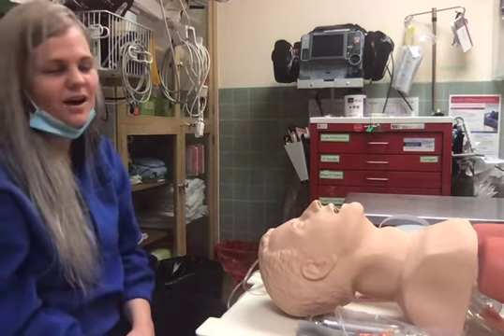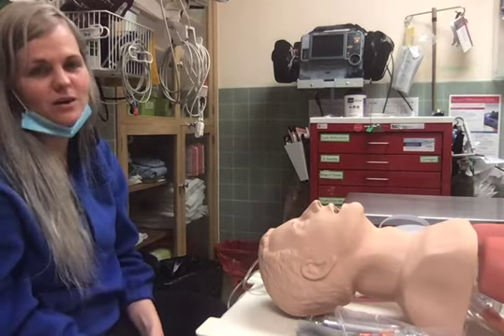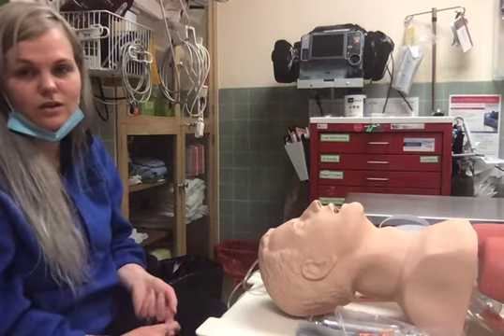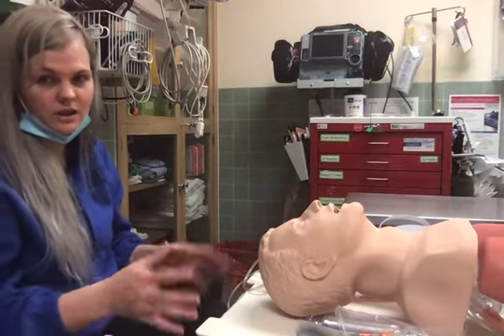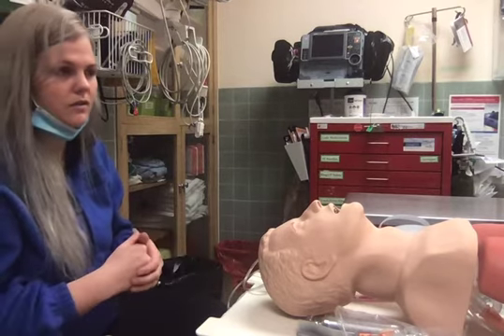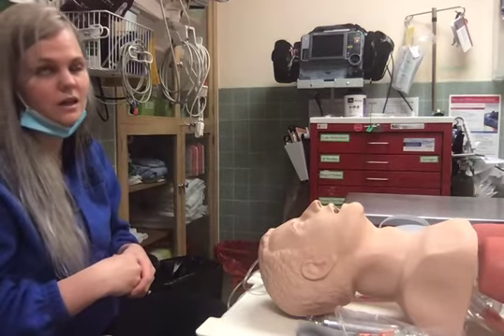So while you are ventilating this patient with the pressure assist control method, you're going to be monitoring your exhaled tidal volumes. Based upon ideal body weight, that's where you want your target. That 6 to 8 mL/kg is what's accepted through ARDSNet, if you're familiar with that. And even then you can go as low as 4 if necessary.